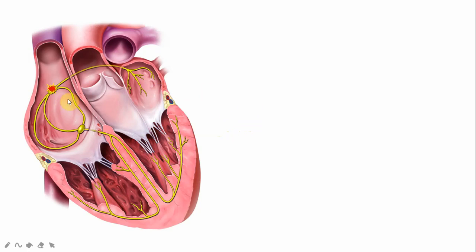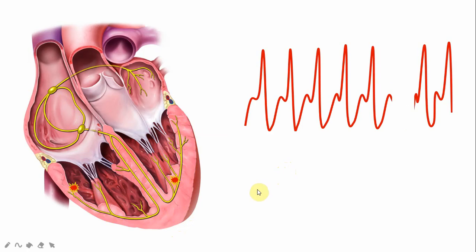The patient has a sinus SA node generating some cardiac impulse, but the patient also has some insult in the apex of the left ventricle, and that is generating cardiac impulses at a very fast rate. So this is going to be VT. If you look at the ECG, it is a little different this time from the previous ECG. We can see a positive deflection here. This is the isoelectric line. There is a positive deflection of the R wave, and there is an S wave here. So the first Brugada criterion, the absence of an RS wave, can be excluded.